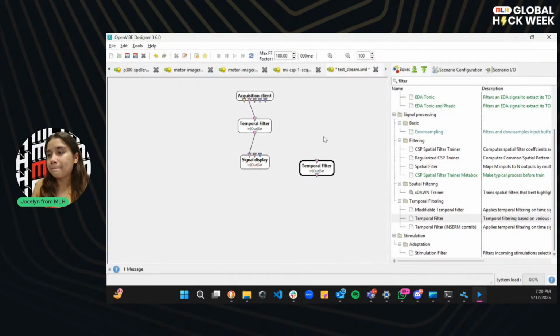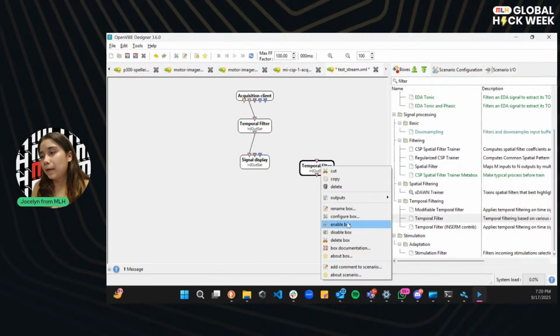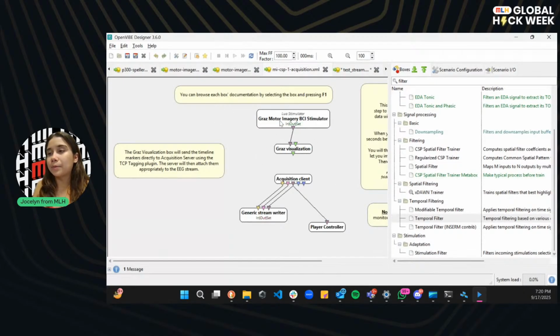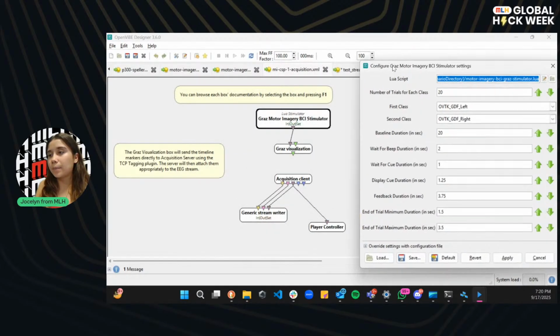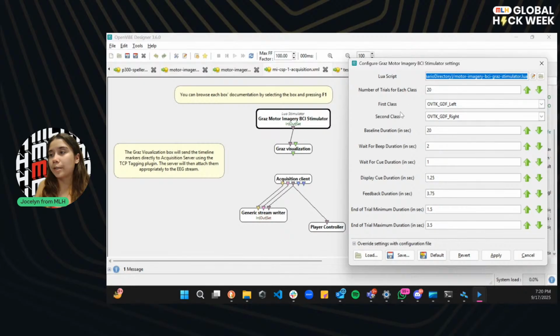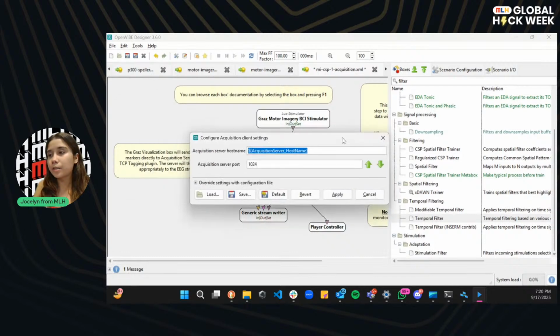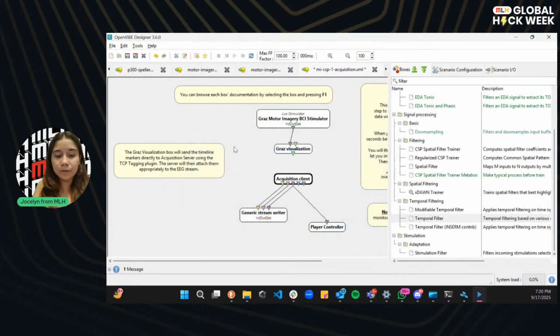There we go. Great. So yeah, basically with OpenViBE, you can build different things. I can also show you some examples of what motor imagery actually looks like. This is an example of a brain-computer interface using motor imagery. In this case, we are detecting two classes, a left class and a right class. Those classes can be basically anything. I don't think it works with a generic oscillator because you need to have something trained. Yeah, I'm getting errors in here.